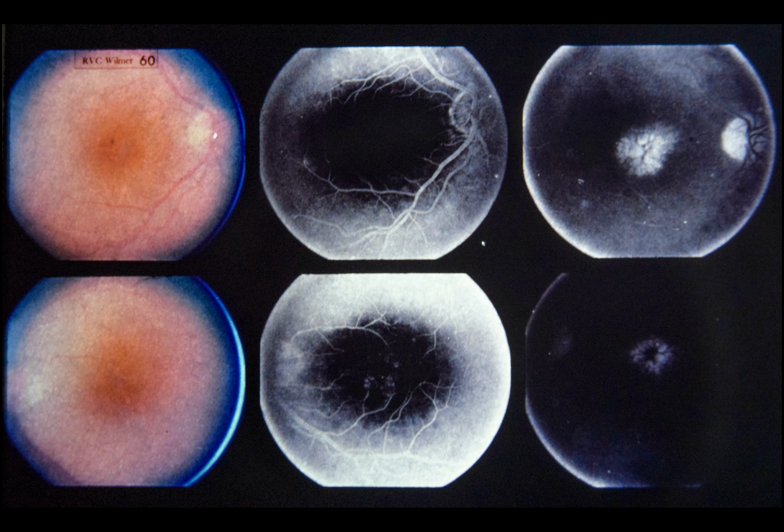There was no evidence of inflammation in the aqueous or vitreous in either eye. The ophthalmoscopic findings in the macula were unremarkable and showed only a loss of the foveal reflex, upper left and lower left. However, fluorescein angiography showed dilatation of the parafoveal capillaries in the mid-stages of the angiogram, upper and lower center, and definite cystoid maculopathy 20 minutes post-injection, upper and lower right. Cystoid edema was also seen with fundus contact lens examination. In addition, white membranes on the inferior pars plana were present in both eyes.